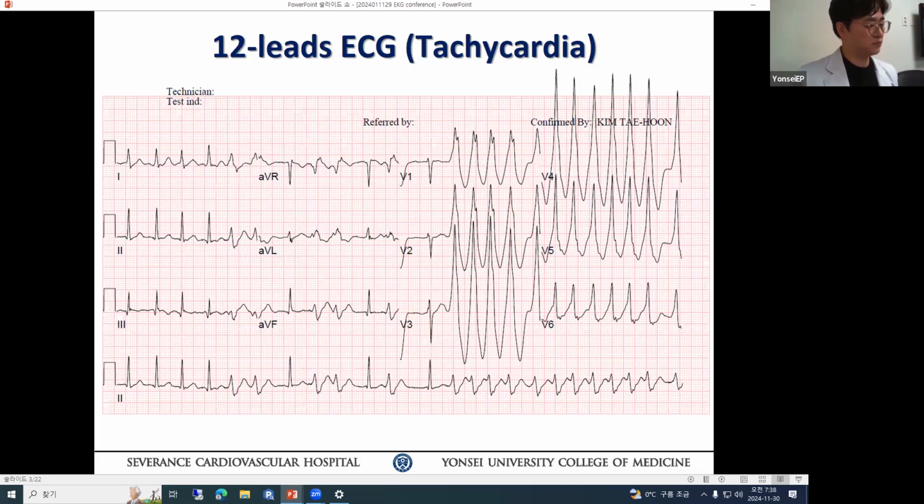So when the atrial fibrillation ventricular response rate gets faster, if you have normal conduction, your RR interval tends to regularize. Okay. But initial vector of the QRS, as he pointed out, lead 1, and then also if you look at lead 3 and lead 2, they are all true bipolar.